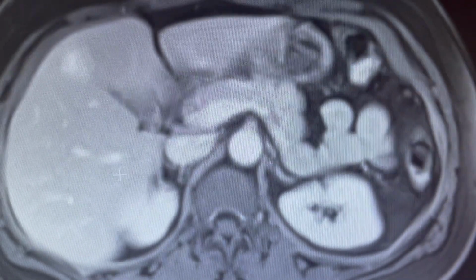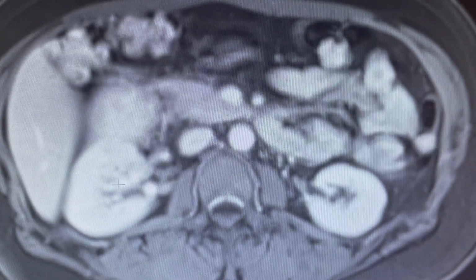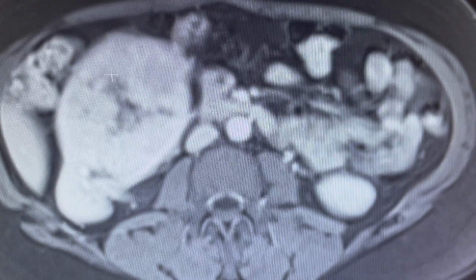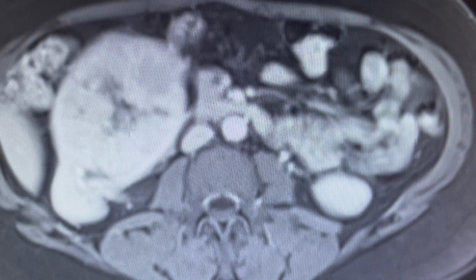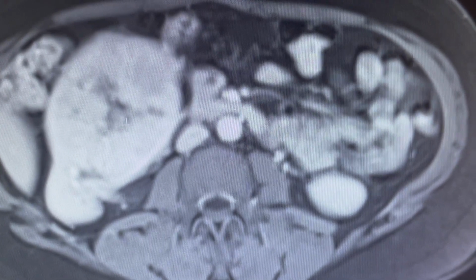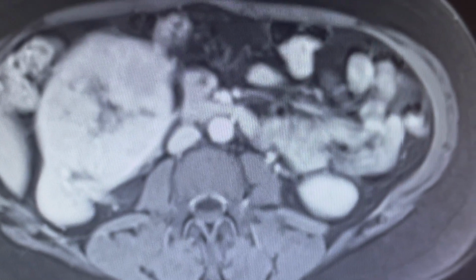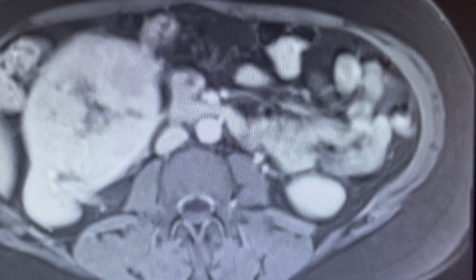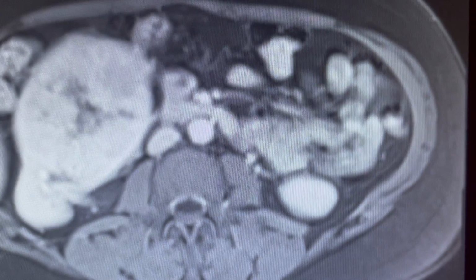And we'll take a look again at the renal mass, and we can see that the renal mass shows central lack of enhancement. So now we know that this isn't just edema inside a solid tumor. This is central necrosis.